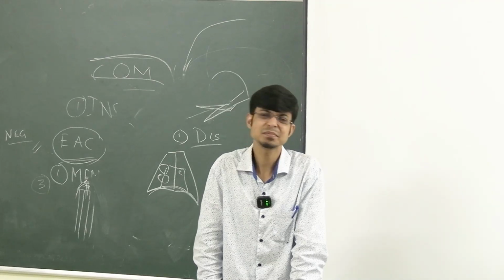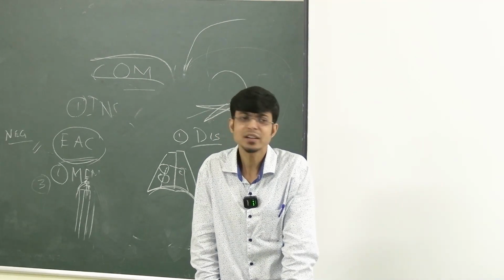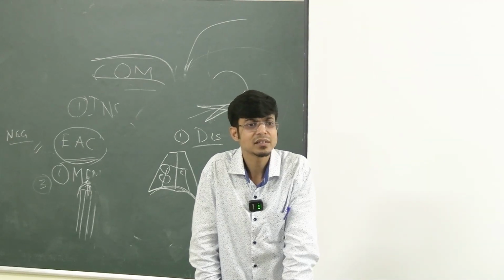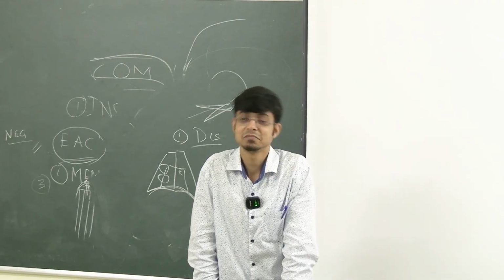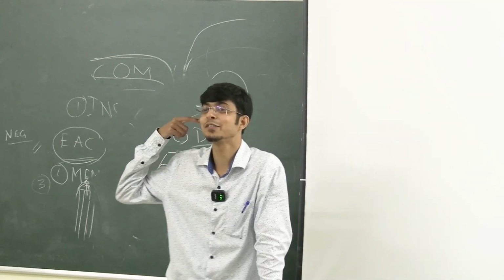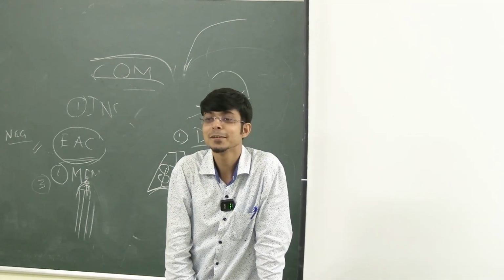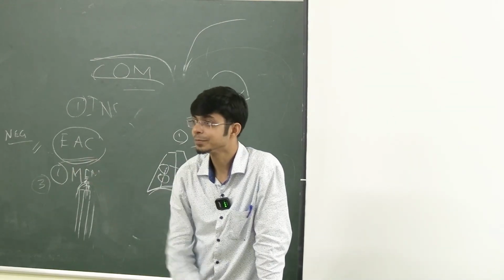Dysphagia. Why would the patient have dysphagia? It's high up in the nasopharynx. Adenoid is in the nasopharynx, right? Patient will come to you and tell you, sir, I'm having otitis media with effusion. Can you check my adenoids, please? No, this is not it. Huh? Difficulty in breathing. Okay.